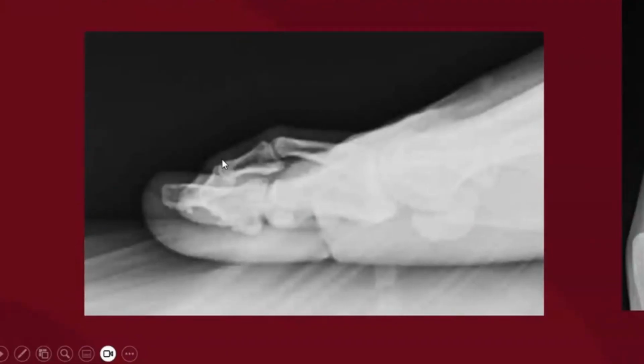In addition, on lateral projections, we can pay close attention to the detection of hammer toes. And this is a great place to stop and see. Hammer toes are generally a result of hyperextension at the MTP and a compensatory flexion at the PIP. Of course, we can have toe clawing, where we can have flexion deformity at the PIP and DIP in a state that can be seen also in neuropathic articulations.